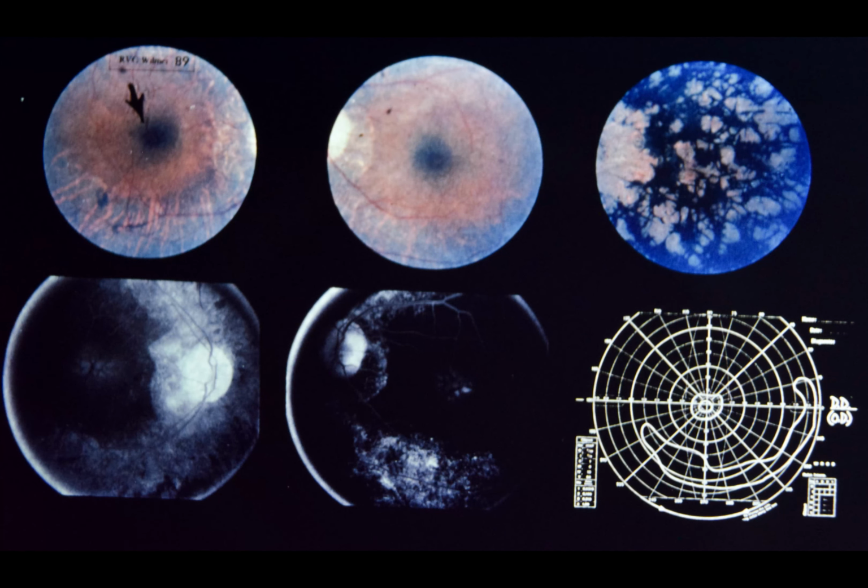Slide 89. Retinitis pigmentosa with cystoid macular edema. This 42-year-old white male has been night blind since age 17. For the past 3 years, he has noted progressive loss of central vision as well. Visual acuity was 20/40 in each eye.